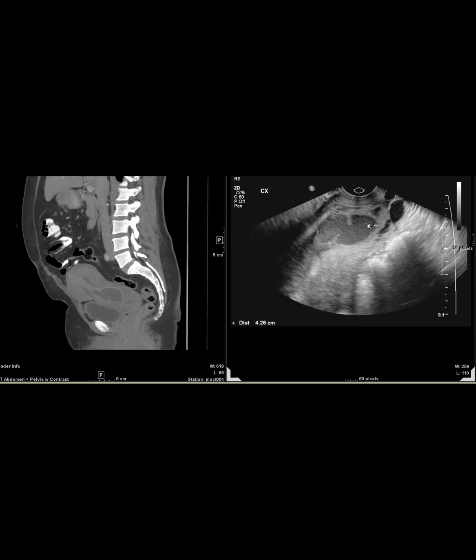Christina is saying prolapsed fibroid. Right, prolapsed fibroid is of course the first thought. It's super necrotic, so we threw in some sort of polyp with cancer in it.